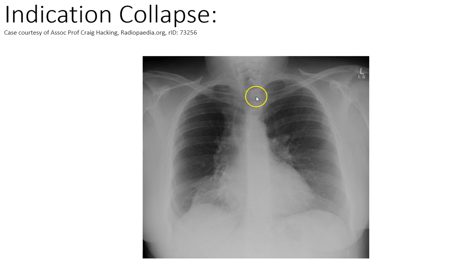Okay, counting the ribs down, 1, 2, 3, 4, 5, 6, 7. So nicely inflated. 1, 2, 3, 4, 5, 6, 7. The hemidiaphragms are in the right places. This one's a little bit more opaque. I do notice this may be a larger person, with some quite large breasts, which might influence it, if it's on both sides, you know, just the opacity in the bottoms.